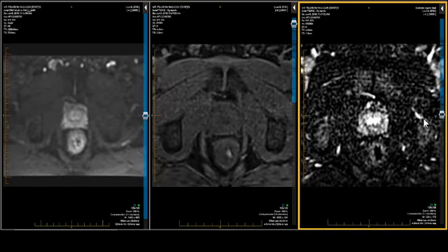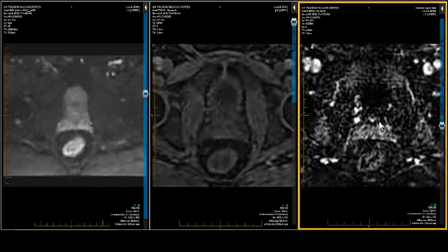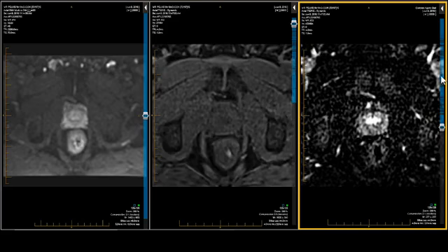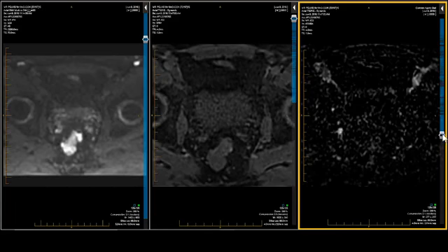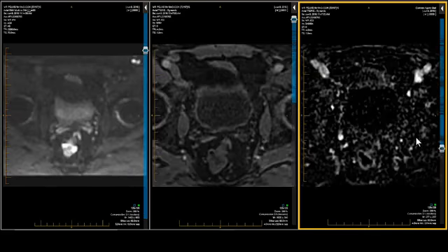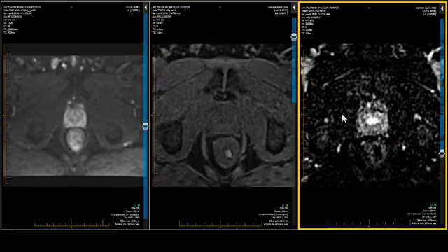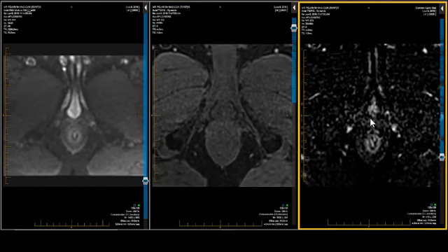It is very common to see enhancement in the central region, especially associated with BPH nodules. It is less common to see it with BPH nodules that are very bright on T2. It is usually the solid, well-encapsulated ones that enhance. So this is normal periurethral zone in the central region of the prostate enhancement. It's absolutely and totally symmetric. It does not in any way adversely affect your criteria of a PI-RADS 1. This is a PI-RADS 1.